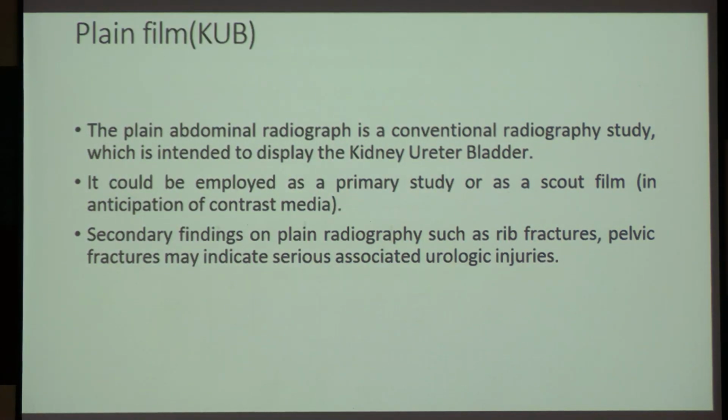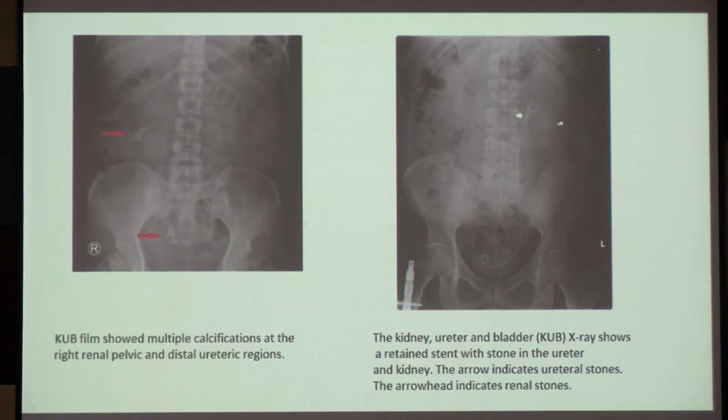This is the first plate that you are going to get in your examination, and you have to say that this is a plain skiagram. It is showing the presence of a rib outline, the pelvis, and the vertebral outlines, but then what else are you seeing here? There is some radiopaque shadow seen in this area, and that radiopaque shadow comes in the renal outline. The interesting question here is not the radiopaque shadow, because everybody will say it's a renal stone.